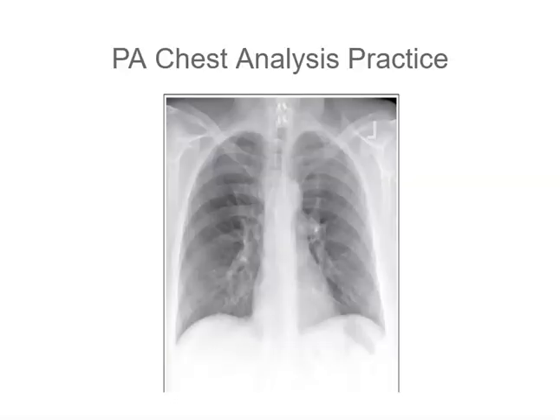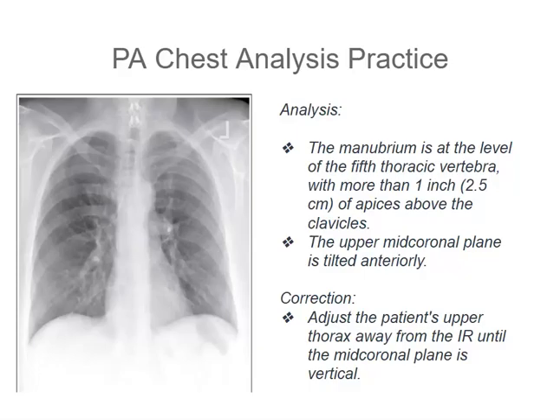Take your time and analyze this image, and then answer the next question. Let's review the practice analysis together.